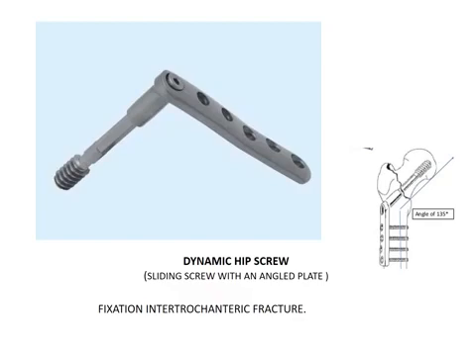A screw in the center of the head of femur with a good tip apex distance. Tip apex means the distance between the head of the femur, the articular margin, and the tip of the screw. If it is appropriate and it's holding onto the strong, deeper bone, this is a very stable fixation.